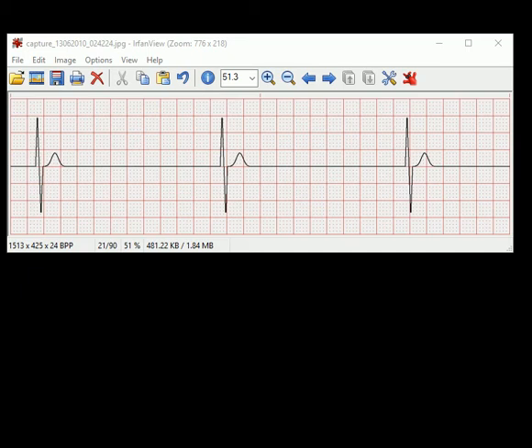The QRS, is it wide or narrow? Well, this looks a little wider than some of the things that we've seen, especially with the drawings, but it's still pretty narrow. And actually, if you look, it's about 2 small blocks wide. Another way you can determine, because it might be a little hard depending on what kind of screen you're looking at this, if you can see the individual small blocks, great. If you can't, you should be able to, at the very least, see the large lines.